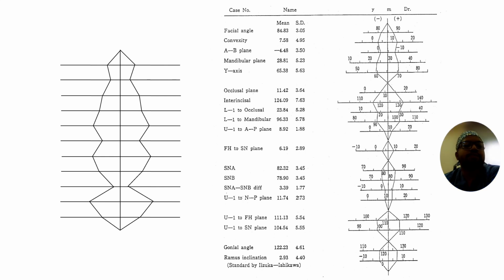When it is placed on the left side, meaning minus, that is less than the average, and when on the right side, it is more than the average. If within the polygon, it means average, or within the middle line it means normal. Within the range is normal. So this is how we interpret the total result.